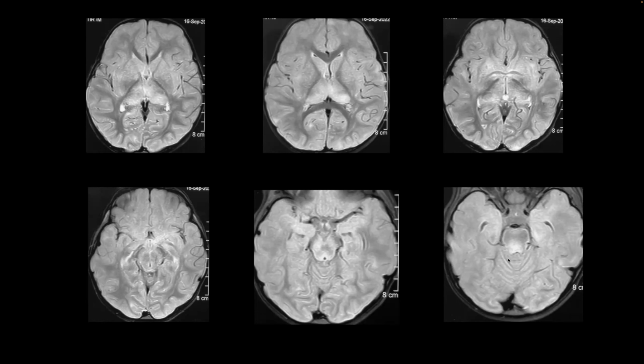But the question is, was this child under anesthesia at the time of scan? No, sir. Because there are sulcal hyperintensities which are commonly seen while giving IV anesthesia or hyperbaric oxygen. So that can be a pseudo-sulcal hyperintense sign, something like that. So thinking of that, yeah.